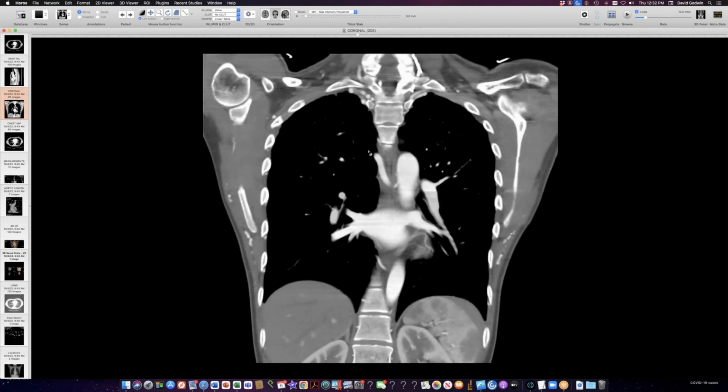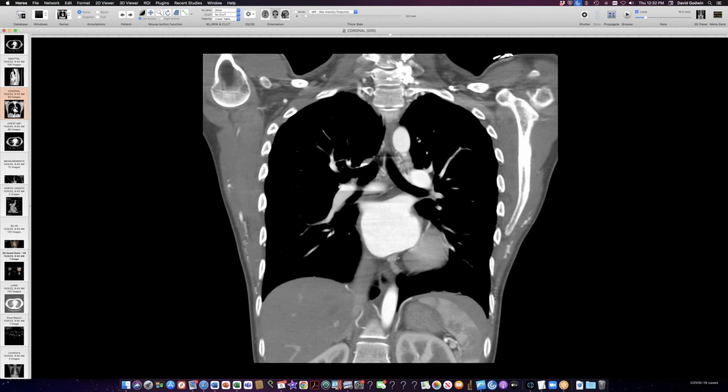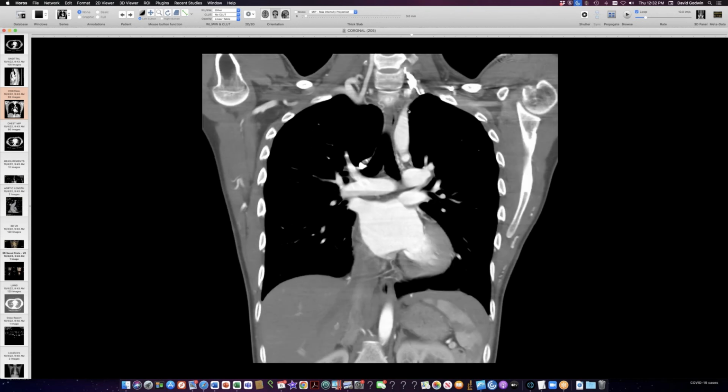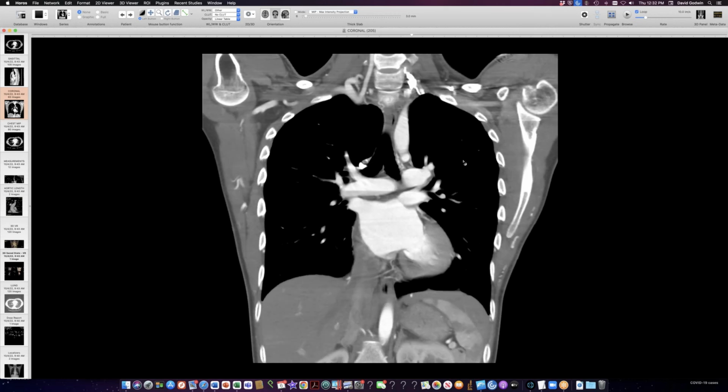So the waist of a 3 should be down here below the top of the aortic arch. It shouldn't be above, as in this case, where the top bulge here is really the subclavian artery. So this ends up being actually a very substantial coarctation.